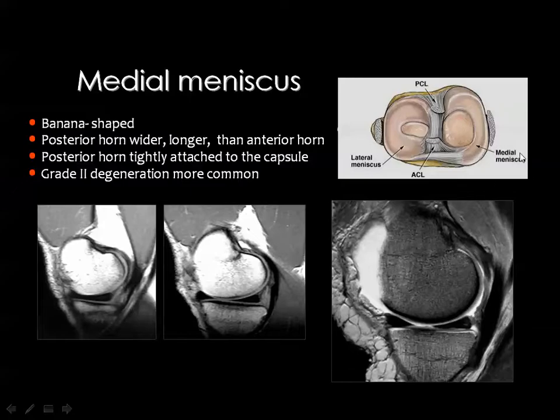And first, you should know that the meniscus is composed of 2 horns, the anterior and posterior horn, and the meniscal body. And the meniscus is wedge shaped, meaning that it is thick at the periphery and thin at its medial aspect. Then the posterior horn of the medial meniscus is the largest horn in both menisci.